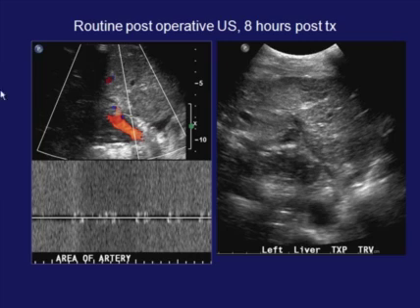So let's look at some examples. This was a routine postoperative study done 8 hours after the transplant, and I should preface this to say that within 12 to 15, 16 hours, we typically do the first bedside ultrasound in all of these patients, even if there are no symptoms. So there we were routinely. Nothing had thought to be unusual about the surgery or the patient's course to this point.